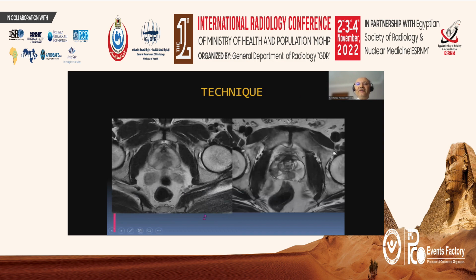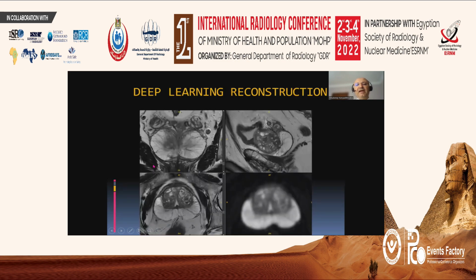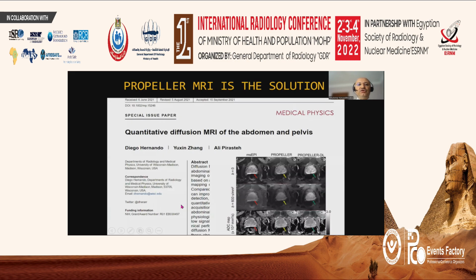So here comes the technique. You can see that this was an outside MR study. This is our study. Definitely, this is a good study. This is a bad study. And also just remember, deep learning reconstruction is amazing. And you can see the details, the ductules within the peripheral zone. So it's a must technique that you should use if you have it.